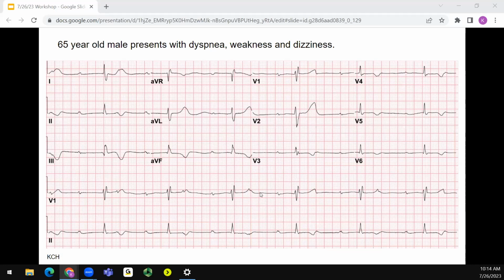And look also at those T waves in 2, 3, and aVF, those big inverted T's, and also something laterally. So we have to worry there may be an underlying ischemia, which can lead to heart blocks. Yes, what Dr. G said, consider ischemia, especially in inferior MIs. It can present as third degree heart block.